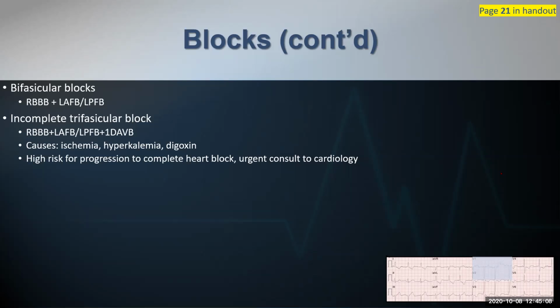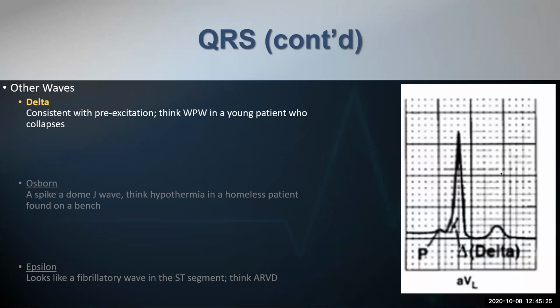As Dr. Seeker mentioned yesterday with his hyperkalemia talk, you might see this with hyperkalemia. So instead of jumping to consider this is an ST elevation, as he talked about in one of the cases, maybe you need to reverse the hyperkalemia. And this can be seen with ischemia as well. So more on QRS. I just put that placeholder because this is becoming a long section.